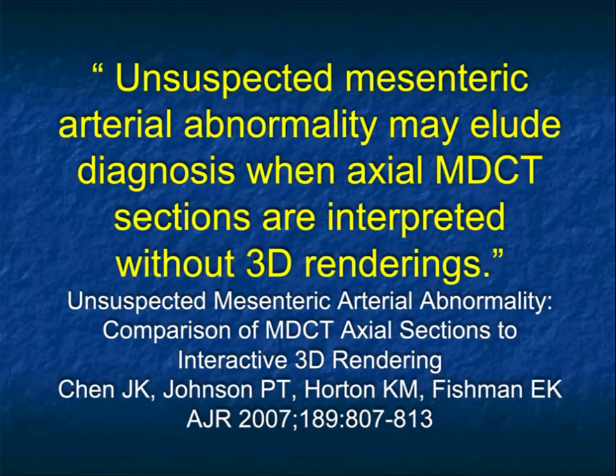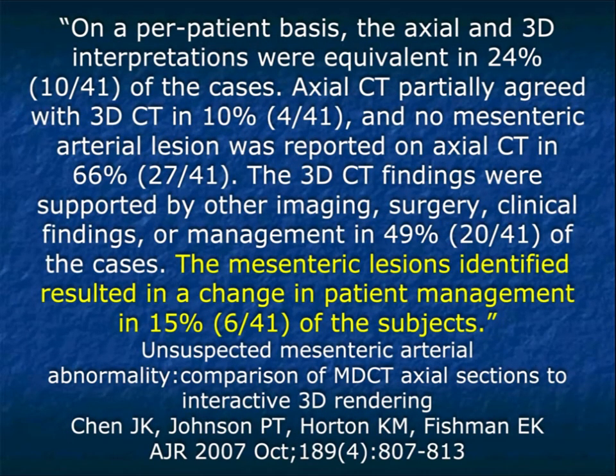Now, another area where post-processing and what you look at routinely becomes critical is anything that relates to the mesenteric vessels. And I typically talk about the SMA and celiac. If you look only at the axial view, it's easy to miss things. Looking at the sagittal is critical, and I don't mean only in patients with pancreatic cancer. I mean all of the time.